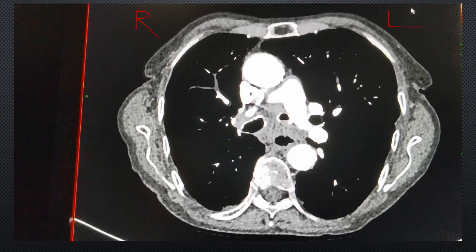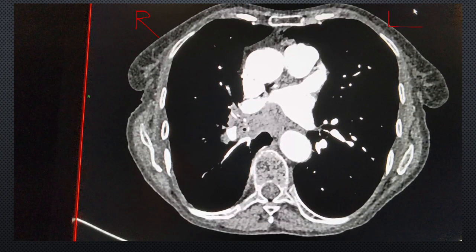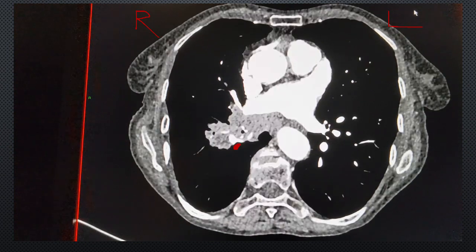Good. We keep going down, and again, remember the sides we're looking at. All of these are small pulmonary branches coming off, and so if you've got a CTPA done, you would see a filling defect if there was a PE here. So instead of being solid, you'd have a small area where it's grey or dark within this vessel, and that's what you would call a filling defect. But again, outside of the scope of foundation doctors.